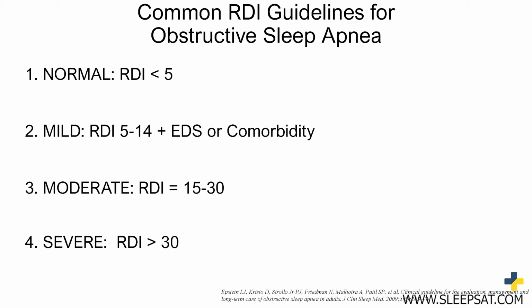I will be showing three examples of each range. Notice how the rest of the pattern-based report changes and how the raw data looks different on each report. RDI is a great tool, but it should always be used in tandem with the rest of the data provided by the SatScreen report.